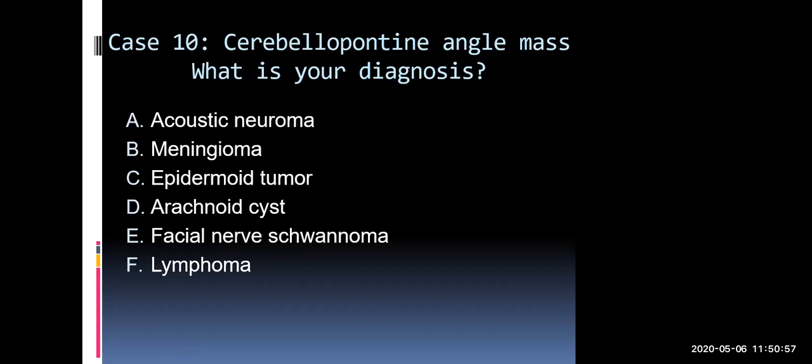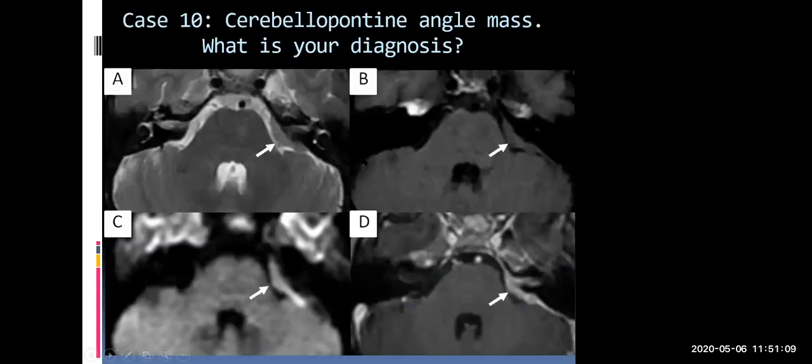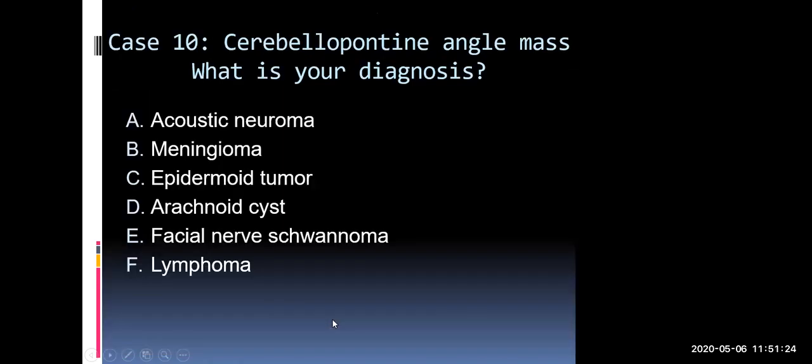This patient also technically could have had just an LP done and spun the cells down from the CSF to see if it is. But this is a very strange case of a lymphoma in the area. Meningioma would have looked identical minus the bright signal of the diffusion. The reason for the bright signal is the amount of protein that the lymphoma cells have, whereas meningiomas don't have that much proteinaceous material in them.